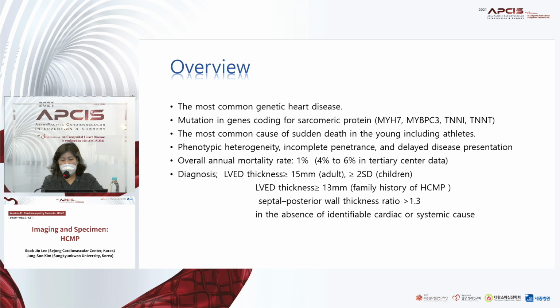So there are very many kinds of morphologic variations. It can be diagnosed when the end-diastolic thickness of the LV is more than 15 millimeters in an adult.